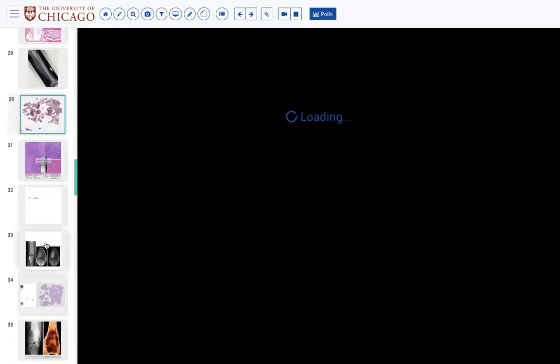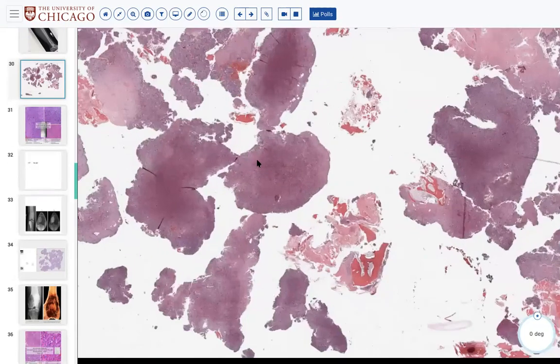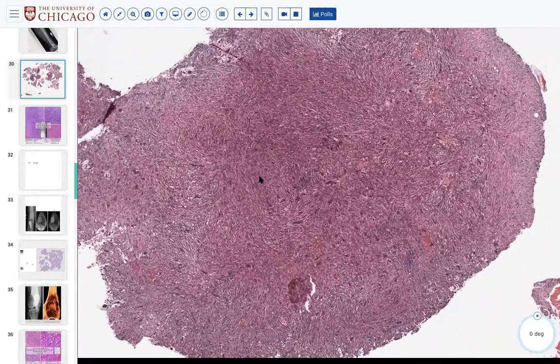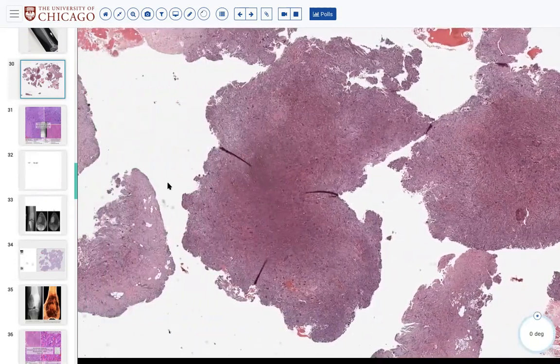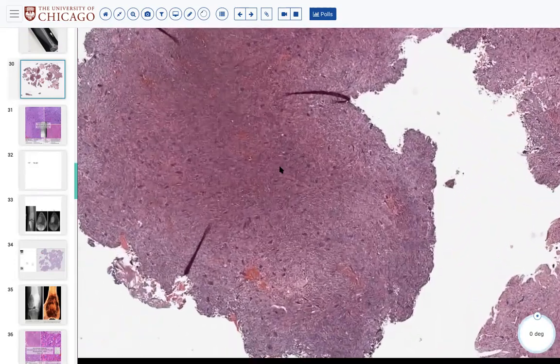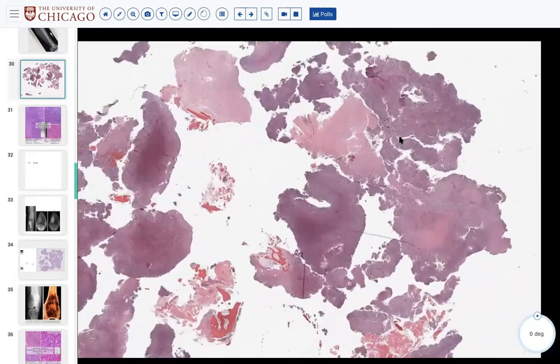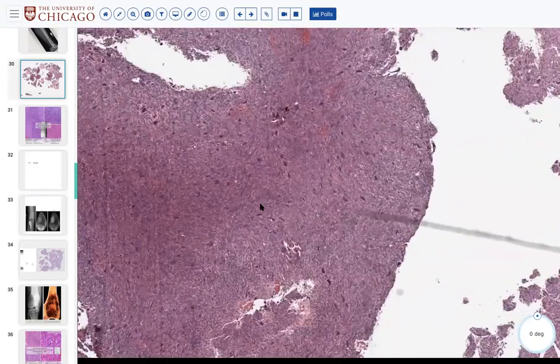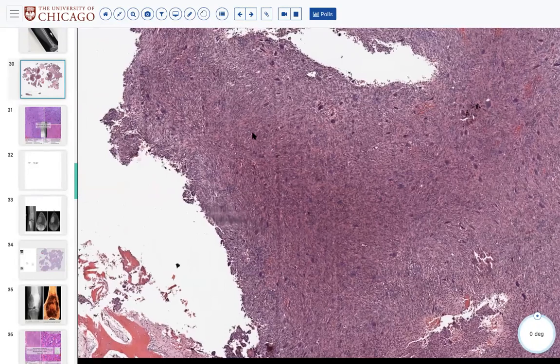And so what the NOF looks like on histology is here. NOF is not a joke. It actually should really not be ossifying. So if you see a lesion that is purely spindle cells with giant cells and little to no bone, that would be a good initial indicator of possibly a non-ossifying fibroma. The reason that this is slightly different from a solid aneurysmal bone cyst is, sorry, it's a little bit thickly cut.